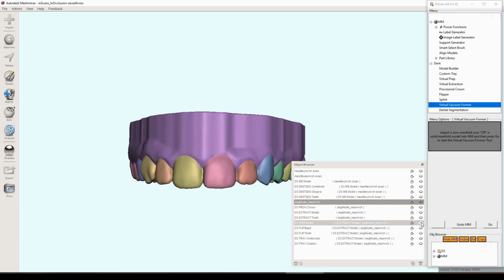So you can give it as parameters a certain thickness, a certain offset value if you want, and it will then generate a perfect shell that goes around whatever object you give it at that thickness and at that offset. So it's a very generic thing, actually. It's a generic tool that can be used in many other industries, even outside of dentistry. But for today's example, we'll be going through just a simple one, but I think it clearly demonstrates how the tool works, and then you can extrapolate from there how you would use it in other use cases.